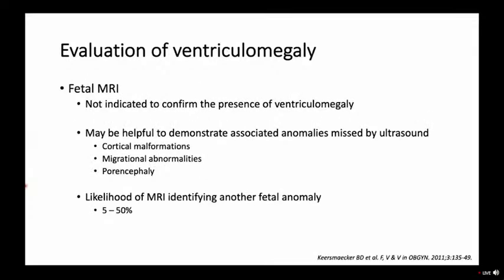Fetal MRI, should we do it, should we not? To determine if there is ventriculomegaly, no, you don't need the MRI. But to determine if there's something else incorrect in that little fetus baby's brain, the MRI is extraordinarily useful.